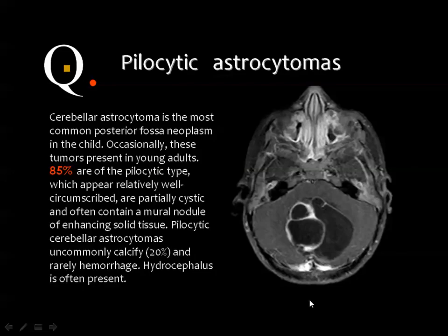I have said that there are many exceptions for the pilocytic astrocytoma, including the small size or the big size of the nodule, the presence of internal septation, the presence of enhancement of the wall, the presence of internal hemorrhage inside the tumor, the presence of diffusion of contrast material inside the tumor. Then the most common cystic lesion in the posterior fossa of a child is pilocytic astrocytoma.